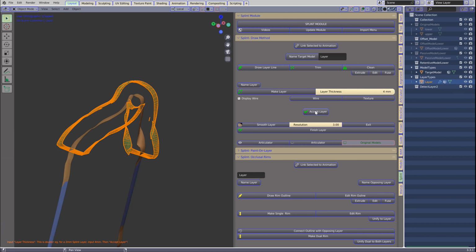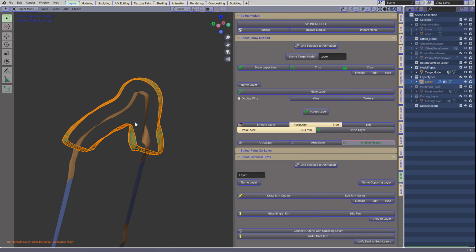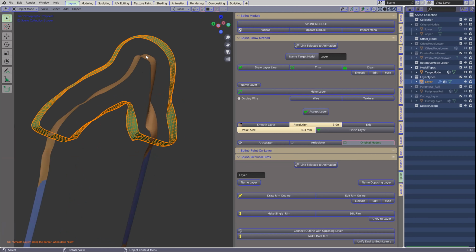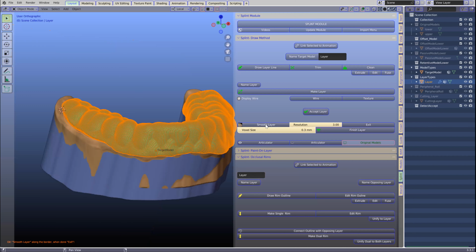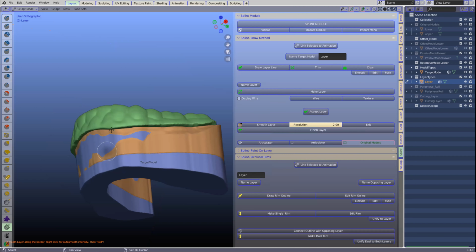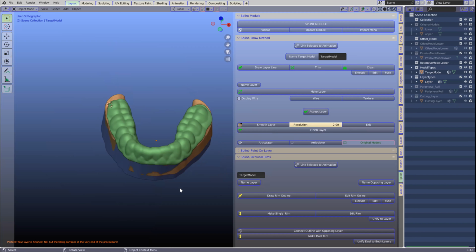So as soon as I click on accept, it's going to remesh it, and it's going to create a layer on the inside and outside. The inside is on purpose because we're going to cut the fitting surface right at the end. So yeah, and then from here we can smooth it again. We can smooth the periphery like this, and then we can exit. It gives us the opportunity to remesh it and finish the layer. Okay, if you've got any questions as far as this is.